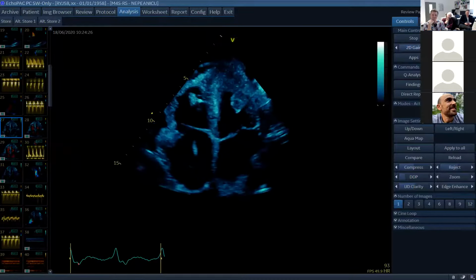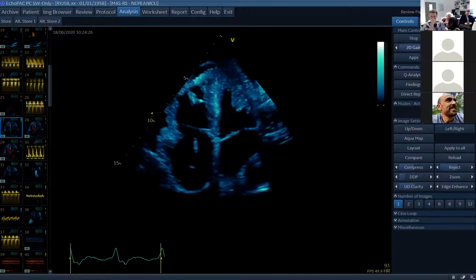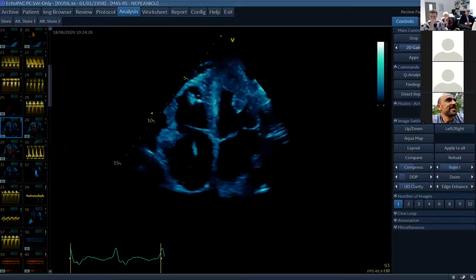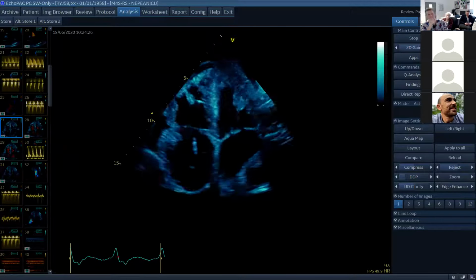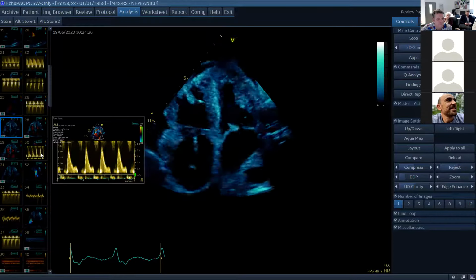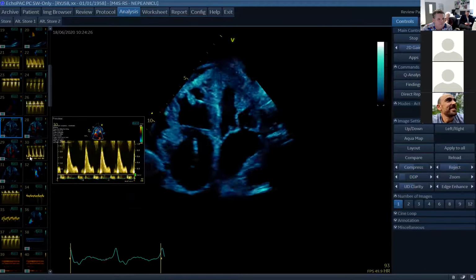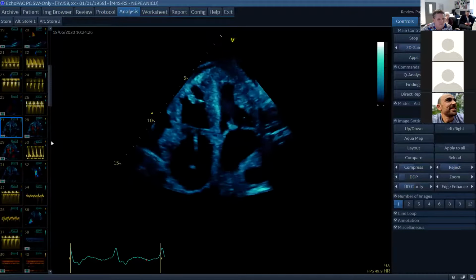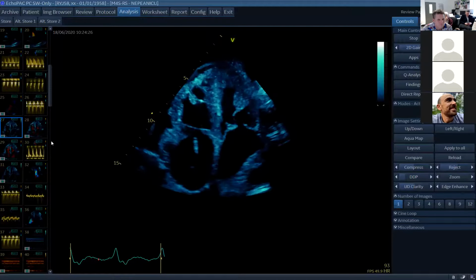The mitral valve leaflets aren't moving terribly well. Both atria appear large. We do expect that the right atrium will be big because there's a pacing wire, so there's going to be some tricuspid regurgitation, but they've also got round bottoms on the atria. The interatrial septum's not dancing side to side. So that fits with the right heart strain and the D-shaping of the septum that we saw earlier.